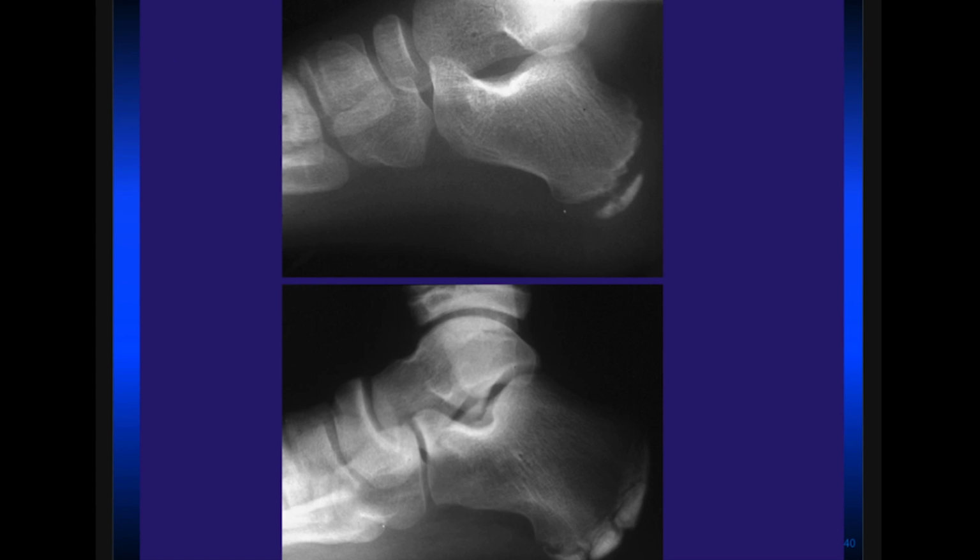These are lateral radiographs of soccer athletes with heel pain. The individual on the top is younger than the one on the bottom, but you can see the varied appearance of the calcaneal apophysis. This is where the Achilles tendon inserts, similar to Osgood-Schlatter's disease of the knee, where the tibial tuberosity is painful. The calcaneal apophysis can also be painful. We see it oftentimes in soccer athletes. Usually it's girls around age 8 and boys around age 10.